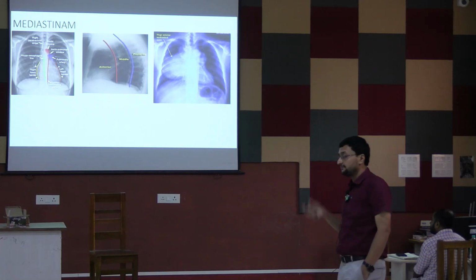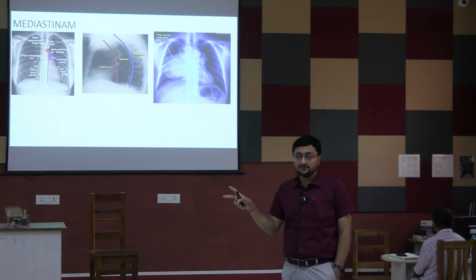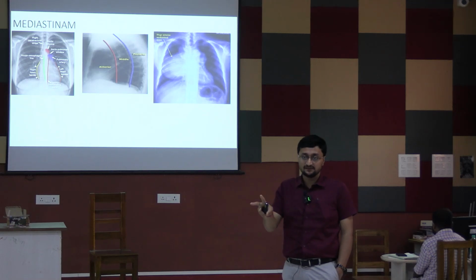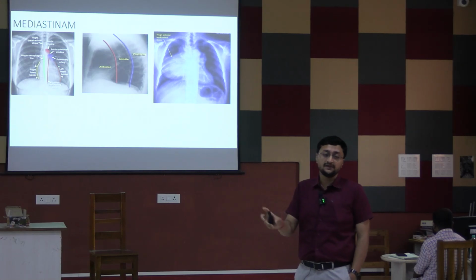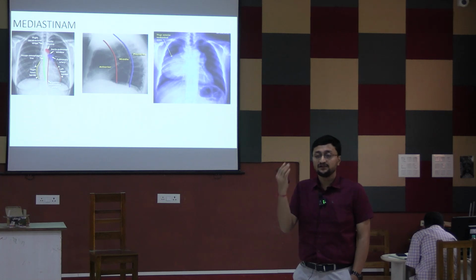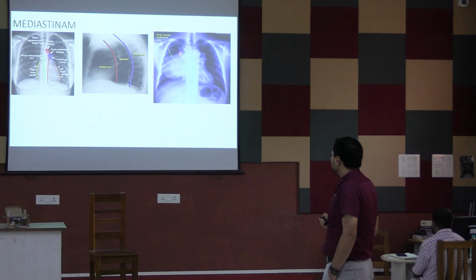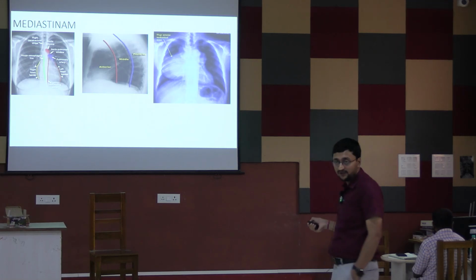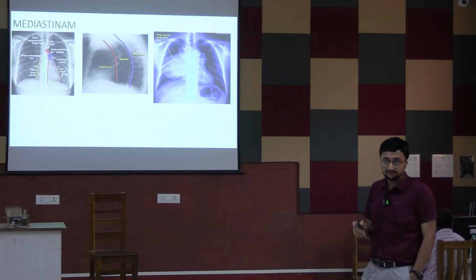Mediastinum. There are three mediastinal areas you can divide: one is anterior, one is middle and one is posterior. The three mediastinum can be delineated at the lateral X-ray, not at the PA view. And this is a huge anterior mediastinal mass, and hilar vessels are prominent. So this is the hilum overlay sign, and the mass is situated at the anterior mediastinum.